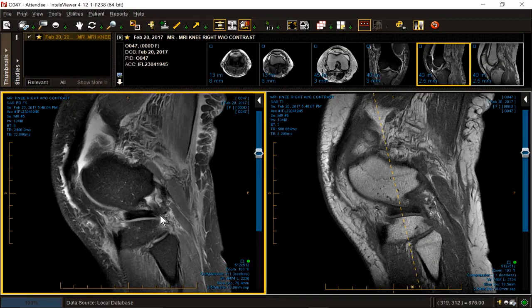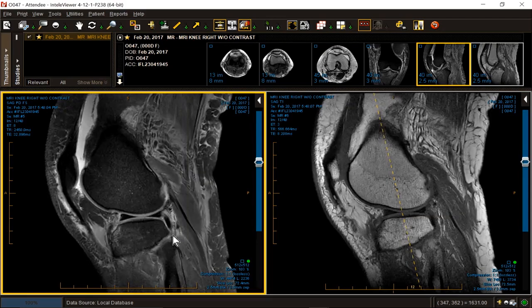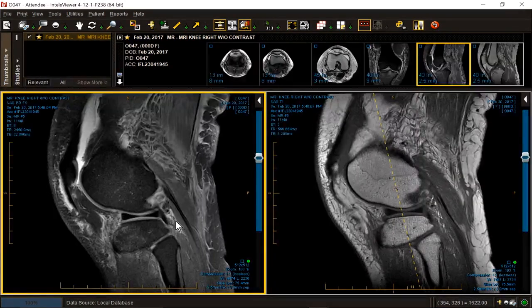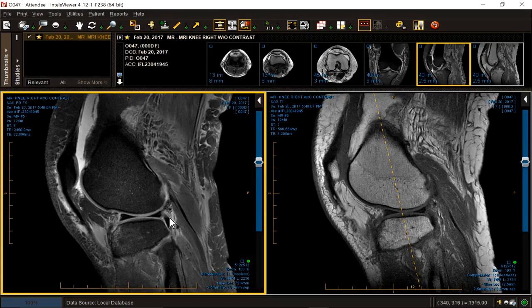There is our popliteus tendon. It's a little swollen proximally. We were right. It's a little wavy distally. And the popliteofibular ligament is torn. Mermaid sign. There's the tail of the mermaid. Yeah, a little bit of it is attached, but most of it's torn. There are some little fibrillary particles or bits of the arcuate. It's torn. So we have a posterolateral corner tear.